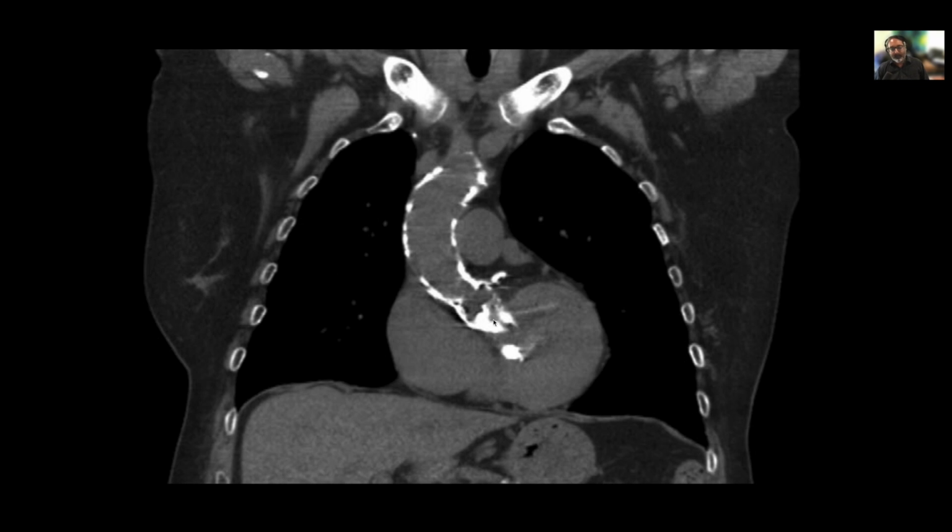Yes, so it is in the aortic valve also, and it has gone up to the ascending aorta. So arteries get calcified with age. People in their 70s start getting calcification in their arteries that can sometimes even be visible on X-rays. And when the valves get calcified, then you've got a problem with the working of the heart itself.